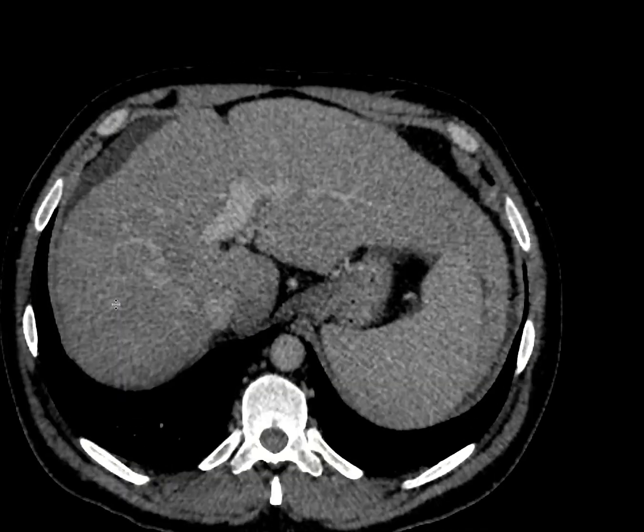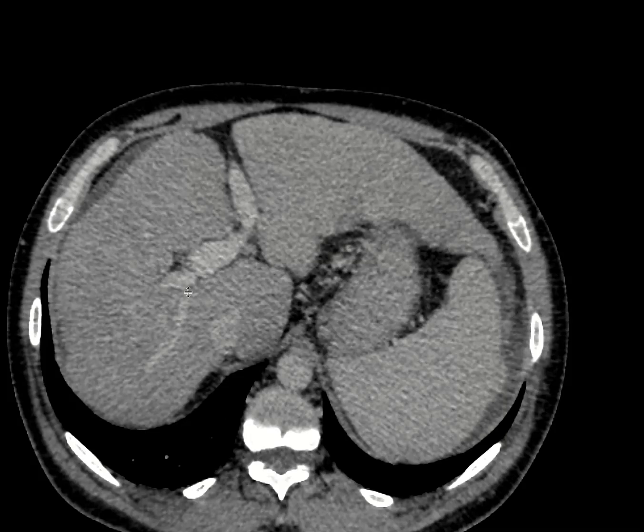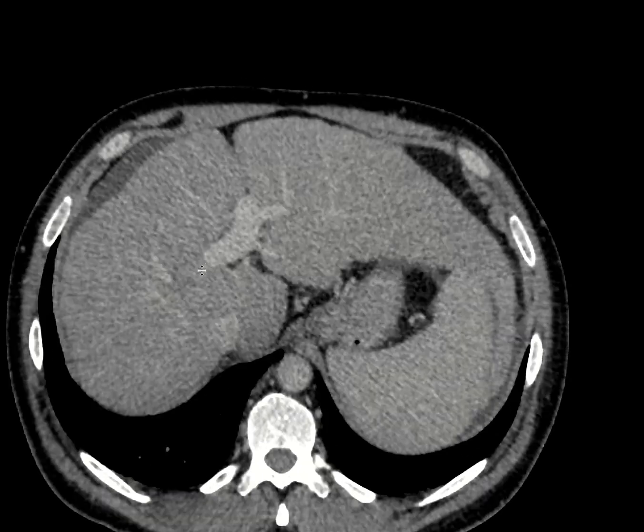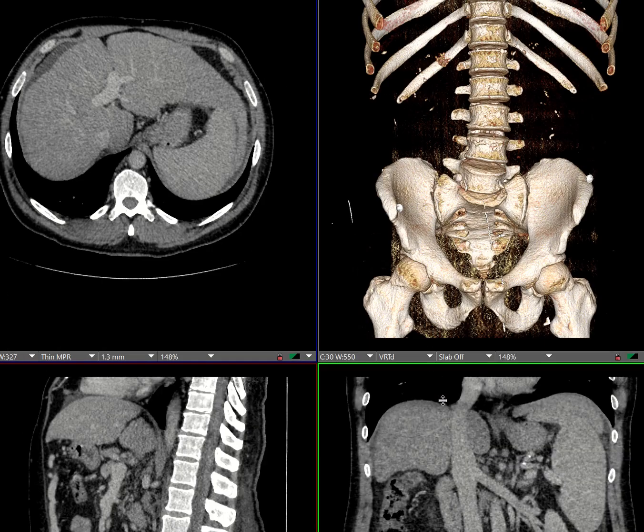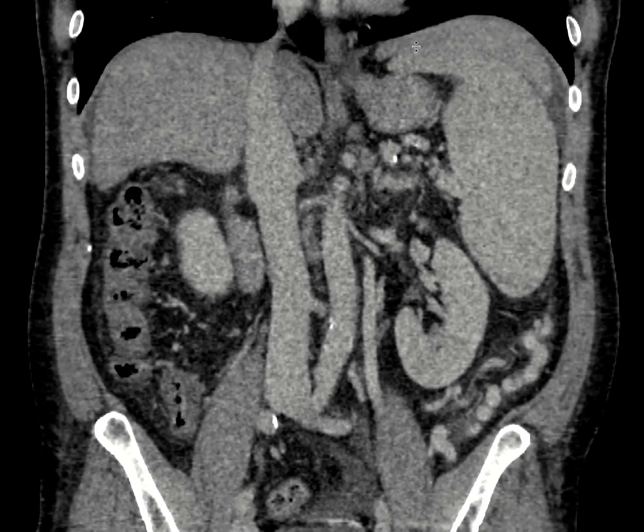And this patient ended up having cirrhosis, and what I wanted to show was some of the manifestations of portal hypertension. So one of the things that you can look at for portal hypertension is to evaluate the spleen. And remember, the liver was coming over, so part of this in the coronal image is actually the liver right here, but the spleen comes from here to here.